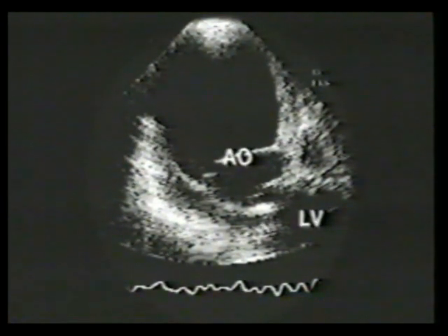Transesophageal echo provides amazing clarity and confidence in identifying aortic pathology, including aortic dissection. However, this does not mean that surface echocardiography should be ignored when confronted with potential dissection. Surface echo is particularly useful in examination of the upper ascending aorta using the right parasternal approach. Although transesophageal echo visualizes the root and proximal ascending aorta, there's a short segment of upper ascending aorta that TEE is blinded to because of intervening trachea.